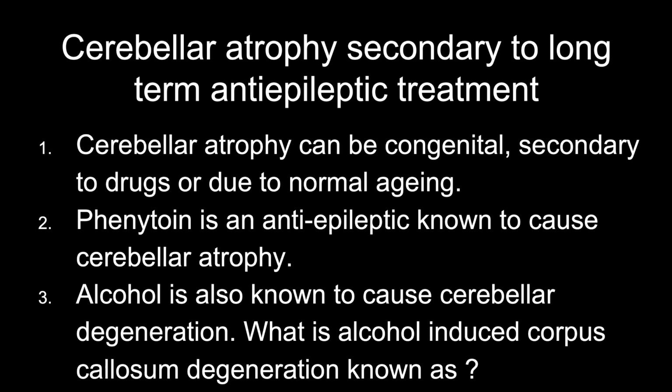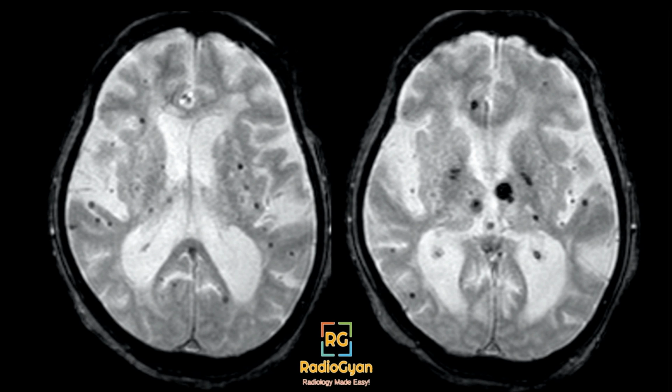Okay, moving on to the next case. What we see here are GRE based images, and I'll let you identify the findings and see if you can put them together.